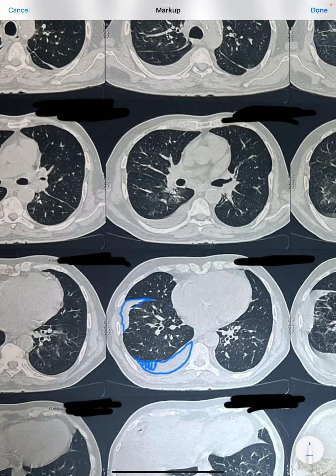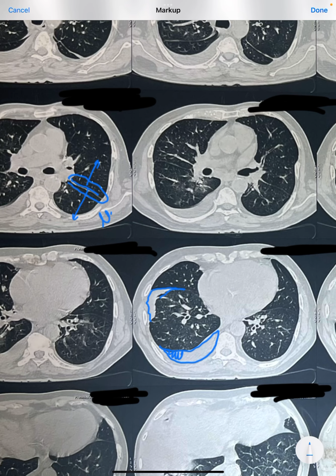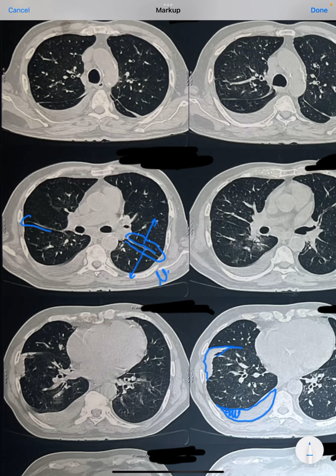This divides this lung lobe from this lung lobe on the left side, whereas on the right side you can see this is the fissure, which is very, very well demarcated. You can see this is fissure. This is very, very well demarcated fissure, which divides the lung lobes. So this effusion is along this fissural line, and it is against the gravity. If you can notice, the effusion is here, which is very well demarcated. So there is a discontinuation between these two effusions. So this is definitely a gravity dependent pleural fluid, which is free fluid in the pleural cavity.